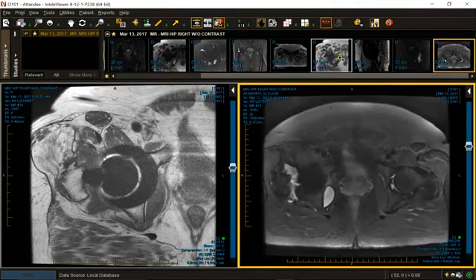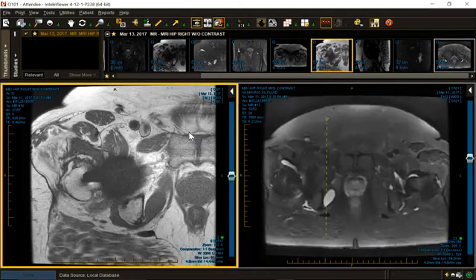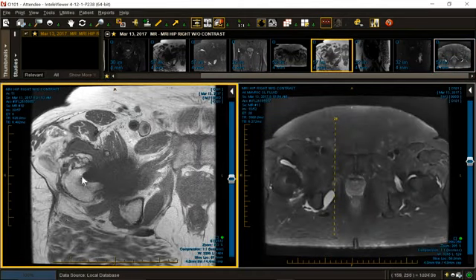Now, sometimes there's one other thing you can do on the T1 weighted image in these cases. You can look at the edge of the prosthesis and see if there is rarefaction of bone. In other words, gray signal intensity. That would be a sign of prosthesis loosening. MR at the margins is pretty good at this. CT is better. So let's talk a little bit about metallosis and particulate disease, which is challenging.